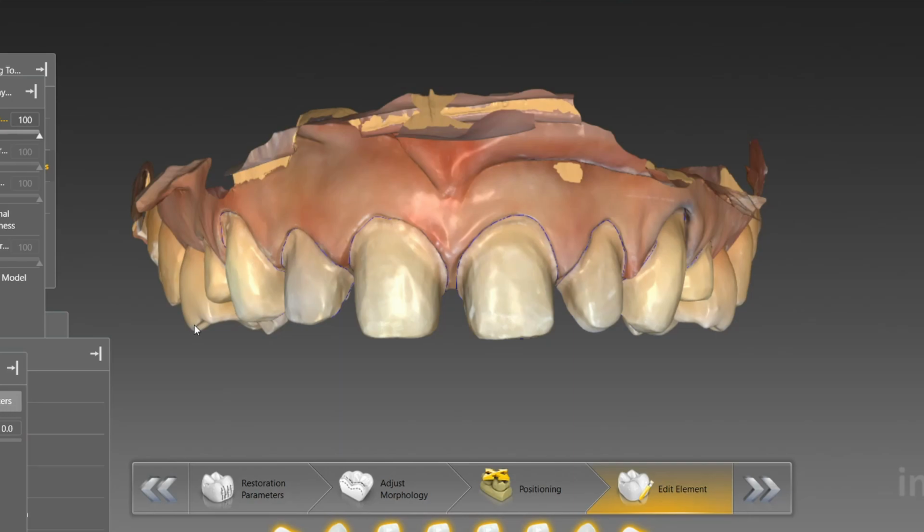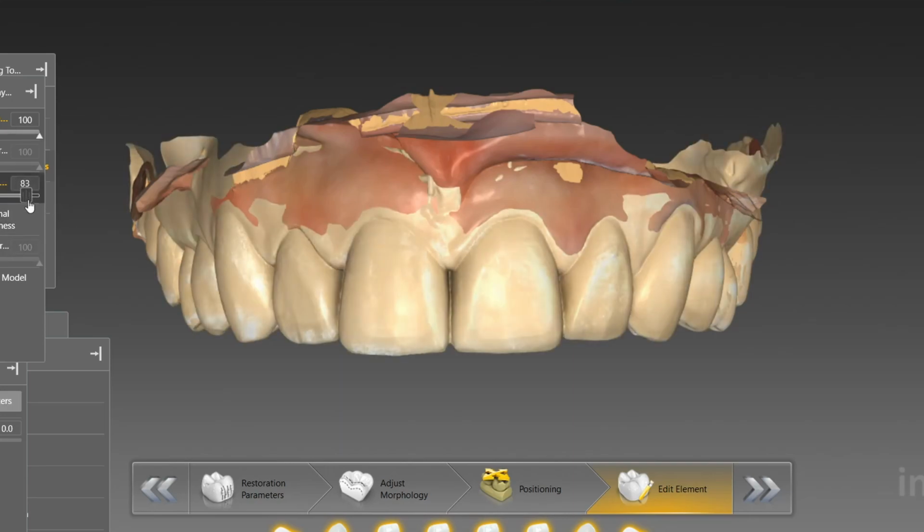So we have our prep scan, and just imagine we have our restoration showing, and we're going to start our design. Before I do my design, or while I'm designing, I'll superimpose the biocopy. This wax up was done by a very prominent dental technician, and I think it's beautiful, but there are some major changes that I would honestly make to it, and I think that you guys will just visually see those changes. For instance, the embrasures just look too closed off. There are some asymmetries that I'm not entirely happy with. Of course, that could always add to the natural appearance, but typically you want your asymmetries to be on the laterals, the cuspids. You don't want asymmetries on the centrals.